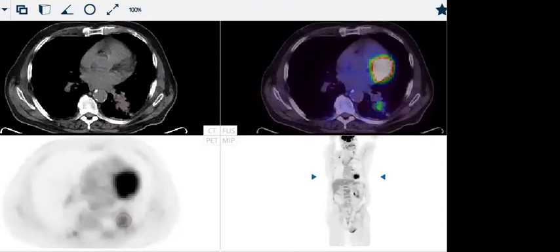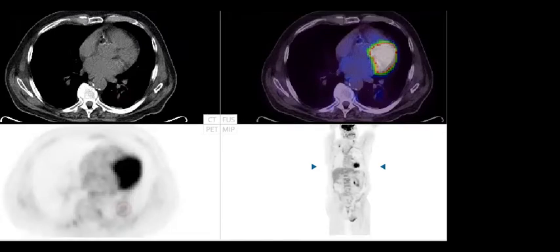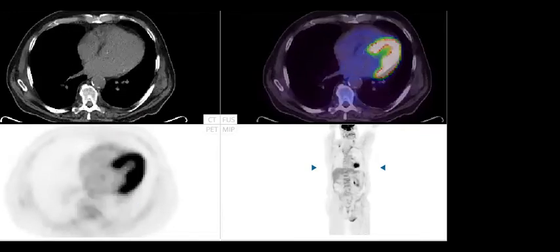So after you check for any masses, here is the importance when you have lung cancer as initial staging. Now for lung cancer they like to use PET-CT as the initial modality. So in many places in the world, if they just see a lung mass on X-ray, they request PET-CT directly, because they consider it the best modality for initial staging right now. For example, this patient has this mass, and they would like to direct the patient to PET-CT to check for any lymph node metastasis or any other lesions. Let's check it when we reach the lung window.